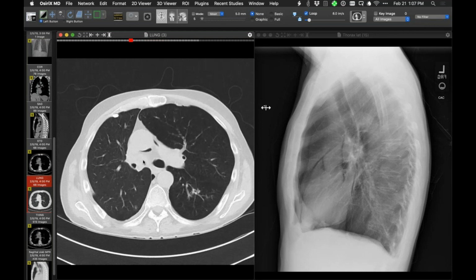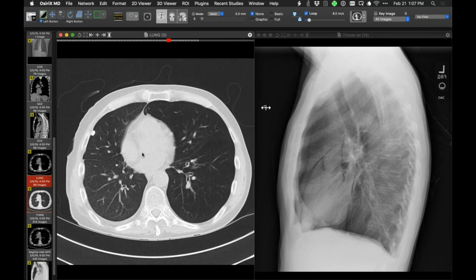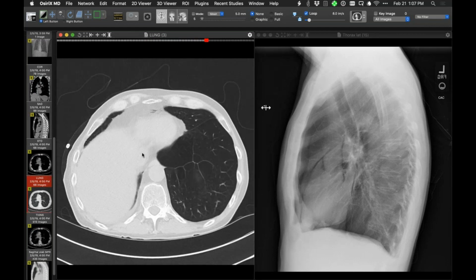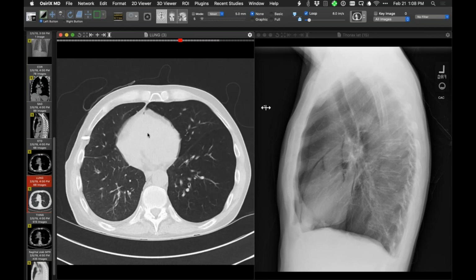There's a bit less air, but that could be a recess. But in front here, that's hard to say, actually, now that you mention that. Let's look elsewhere to see how much is actually in the pericardium. That looks pericardial down there. Pericardial air. And so was this a fresh lung transplant?